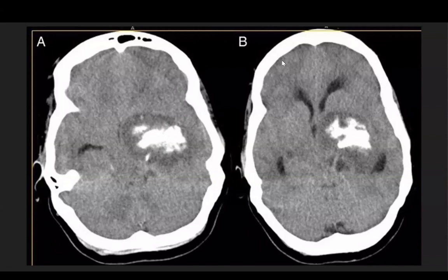Okay. So, Dr. Lalitha has already written in the chat box what this is. This is an optic pathway glioma. Yes, this is calcified, widely calcified. Again, not the very typical radiological presentation we see or associate with the pilocytic astrocytomas. This is mostly a solid lesion which is heavily calcified, and it does not have the solid or the cystic component or the mural nodule, which differentiates PCA.